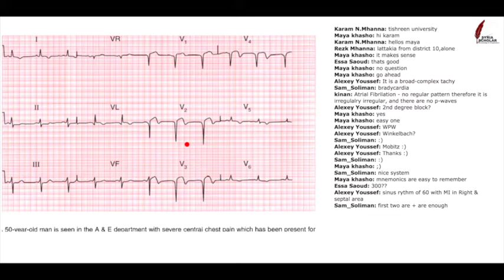Fine. So that's one thing. We found some Q waves. We can see them in V1, V2, V3. You can see them in V4. Can't really see any in V5 or V6. So there's nothing doing this deep dagger Q wave here. So we've got Q waves in V1, 2, 3, and 4.